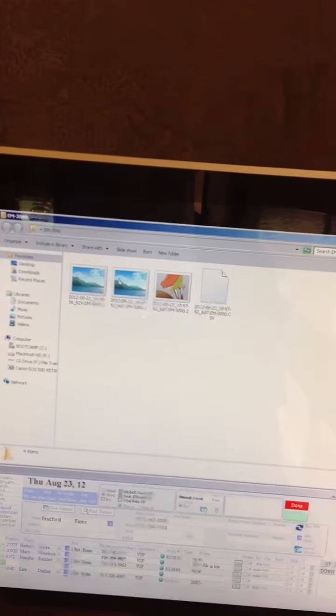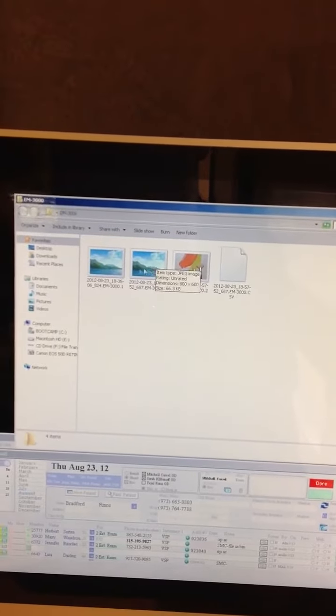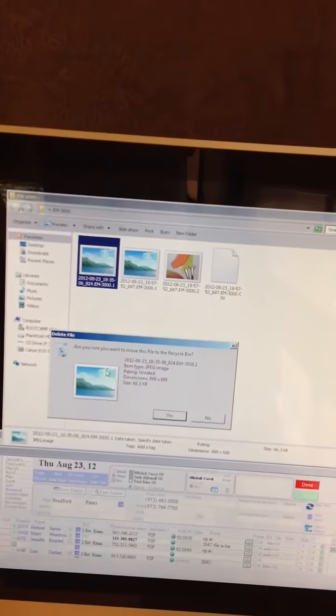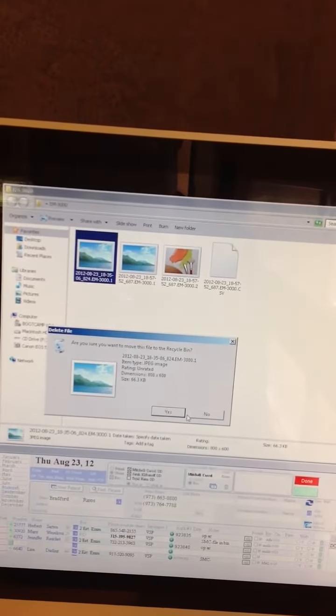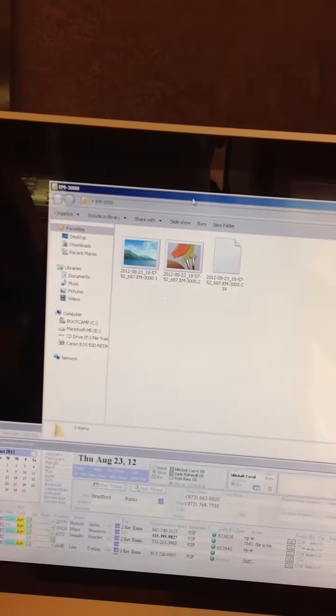If you double click that, you will find a picture file right there. Now, these picture files are the image from the specular microscope. So that was the first one that I did, and when we're done, we should get into the habit, as soon as you put it in the patient record, of deleting it so that it's not there and you're not confused by it. Okay? So now that image is there, get it out of the way.